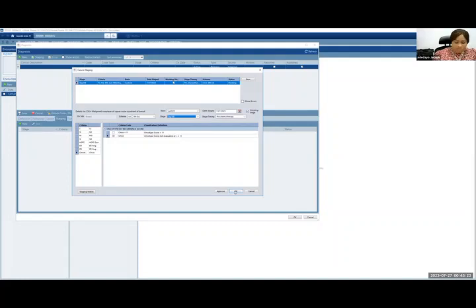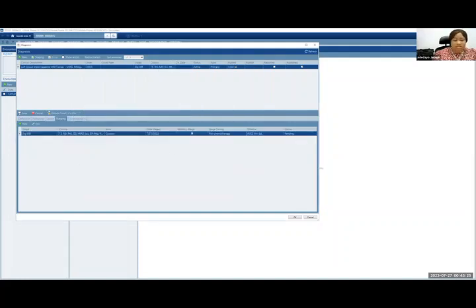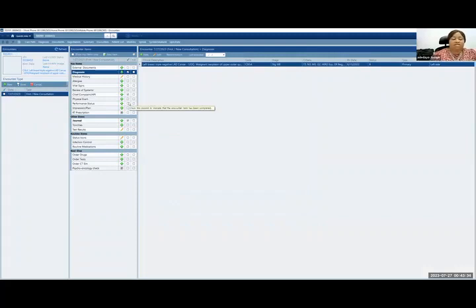So I'm going to approve that. So this is this patient now, and we're going to save this, and this is her diagnosis. I will select OK. Now, let's say she comes back sometime after we've done this appointment and unfortunately has metastasis. Now she has metastatic disease to the brain, the lungs, and the spine. We now have to update our methods, our diagnosis, and all of that.